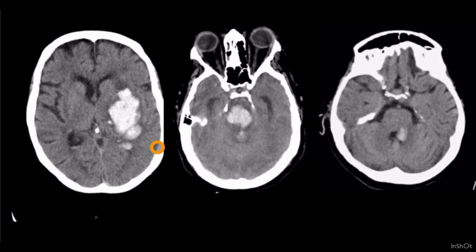One more point for poor prognosis is an increase in the size of the bleed. In that case you will also see a swirl sign, an active bleed in the form of a hypodense focus. In this case you can appreciate a small hypodense spot, and with the passage of time the bleed size increased. So this is the swirl sign of active bleed, and it is also a poor prognostic factor.